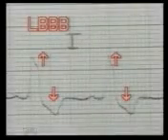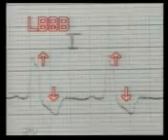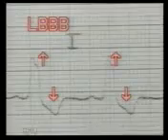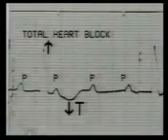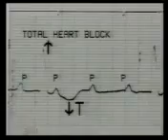This is an ECG of left bundle branch block. Note the RR' pattern, wide QRS complex due to aberrant ventricular conduction, and inverted T wave. This is a complete heart block with ventricular rhythm. Note the regularly occurring P waves and independent QRS complexes which are wide and bizarre with inverted T waves.